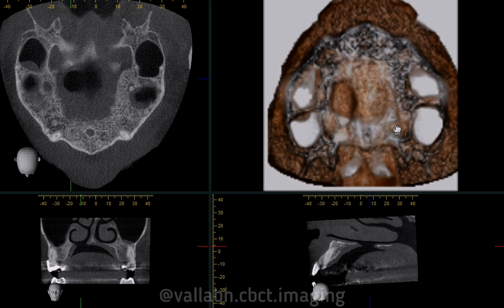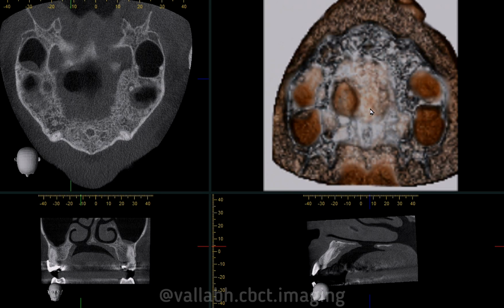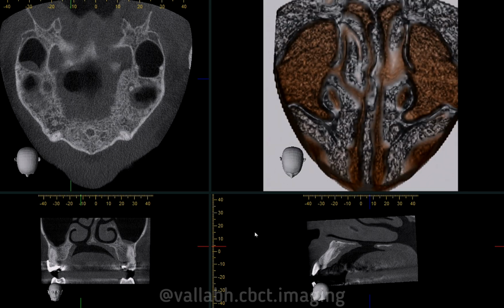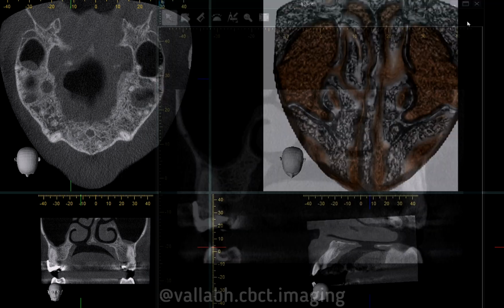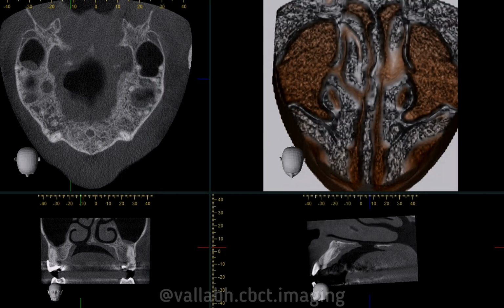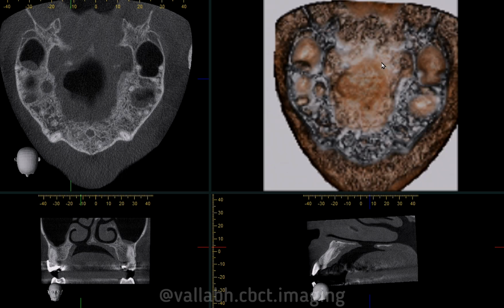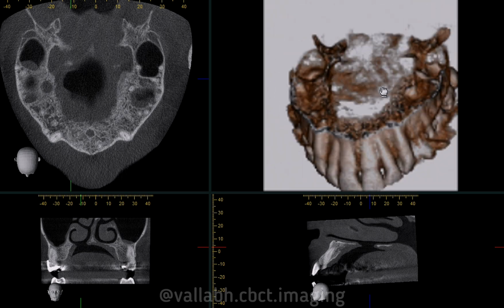We have made an axial cut, and this is the circular defect seen in the axial cross section. If you want to see it in the bird's eye view, we cut this from the top. It is not very well evident in such cases.